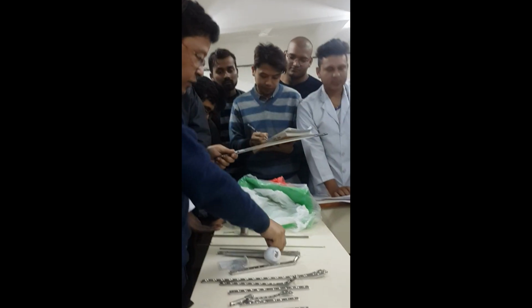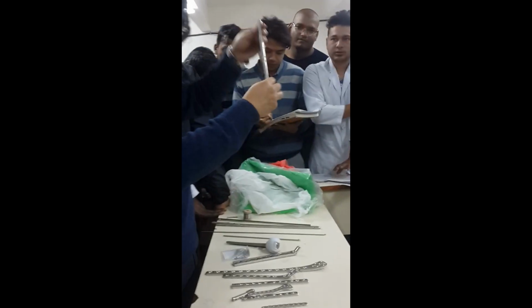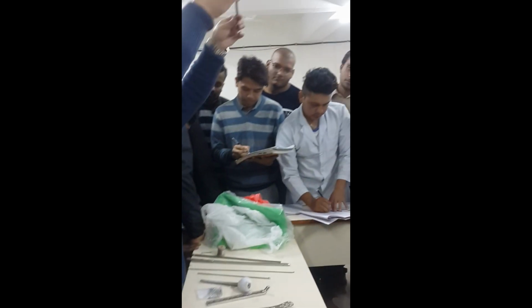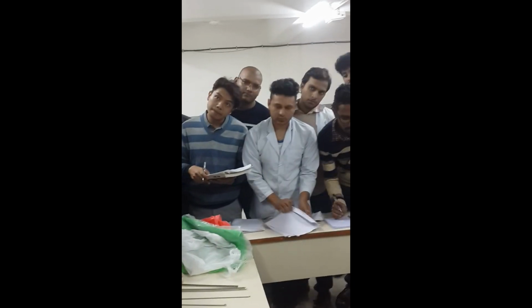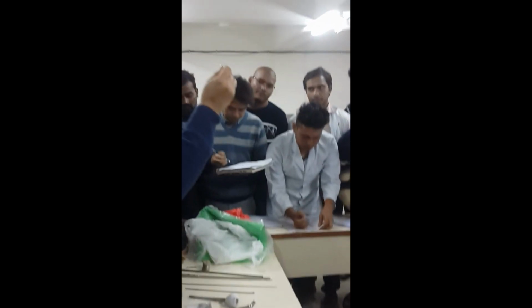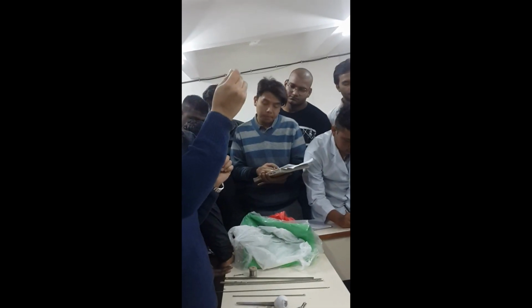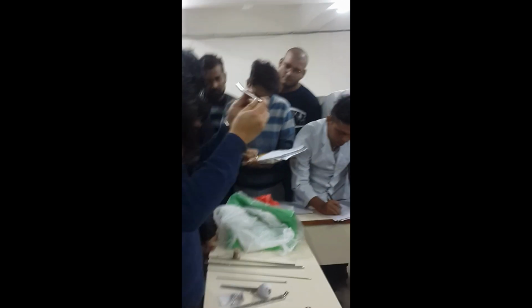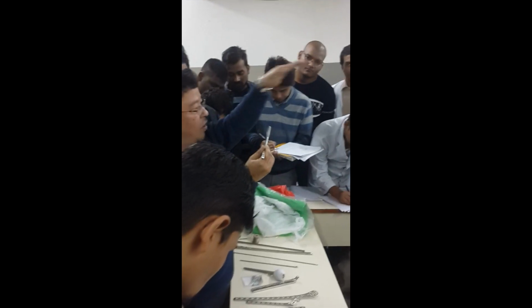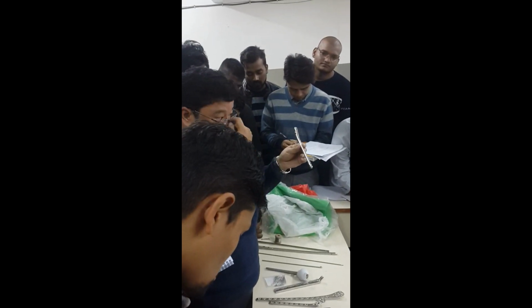Now contrary to this, the tibia nail will have a bend. If you look at this, it is straight and then there is a bend, an angle of around 11 degrees. That angle is known as the Herzog bend, or Herzog angle. This is how you identify them: the tibia nail has this angle, while the femur nail has a long anterior bend. And why is this angle there?